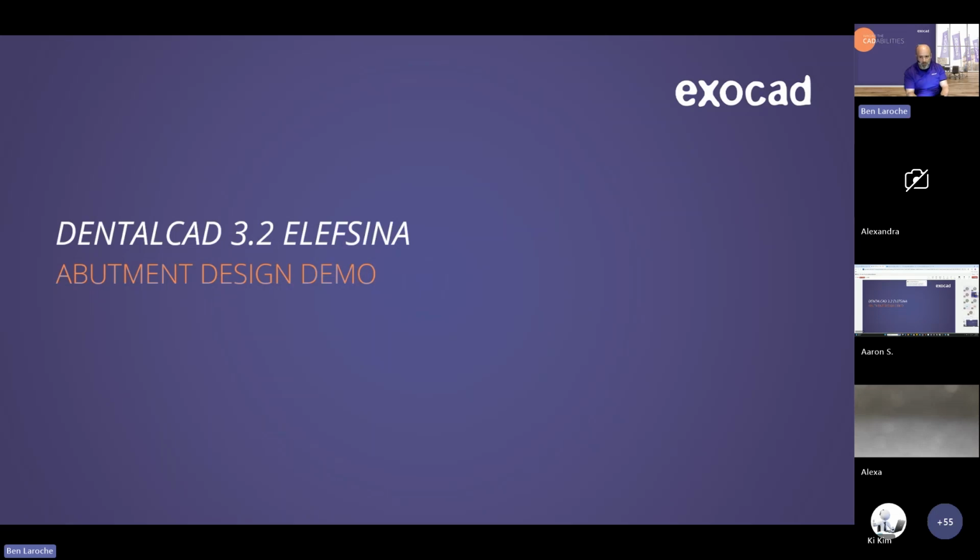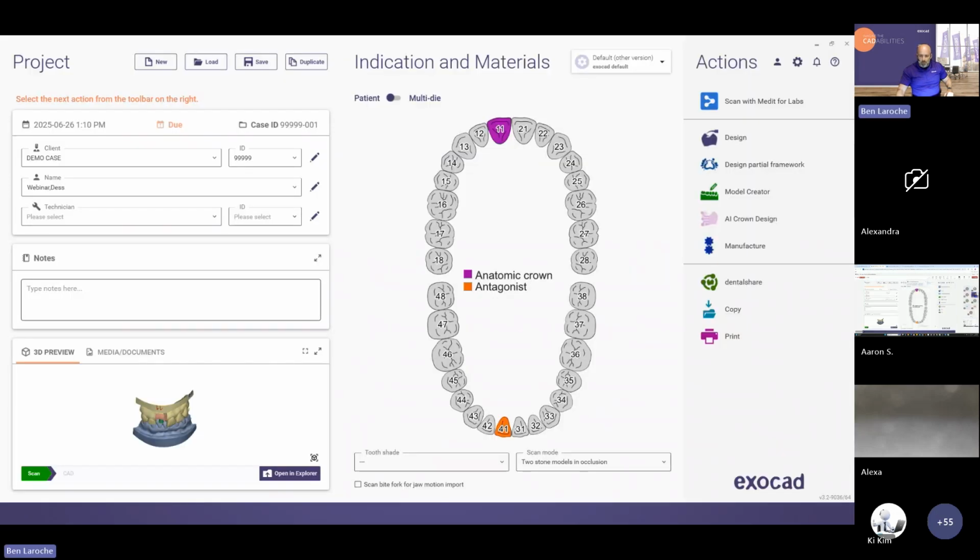Only certain parts fit on other parts. Once you know the implant type, what scan body was used, and what components you're trying to put on top of that implant for the restorative side, it's a process of elimination. Don't be intimidated. It looks like a lot of options, but it's actually pretty straightforward once you get going. So let's get going.